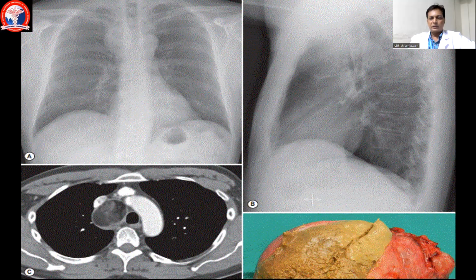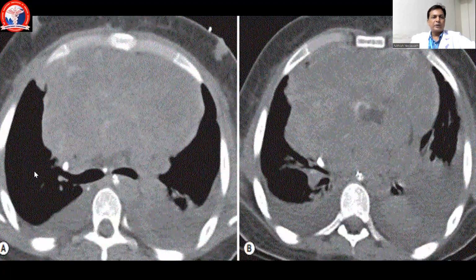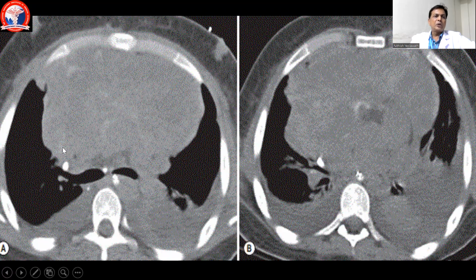Cystic teratoma is, here we are seeing a large heterogeneously enhancing irregular margined mass on CT scan. The mass is displacing vessels. This is a large mass. Bilateral pleural effusion is seen, as well as atelectatic areas in the lungs. So this mass is seminoma.